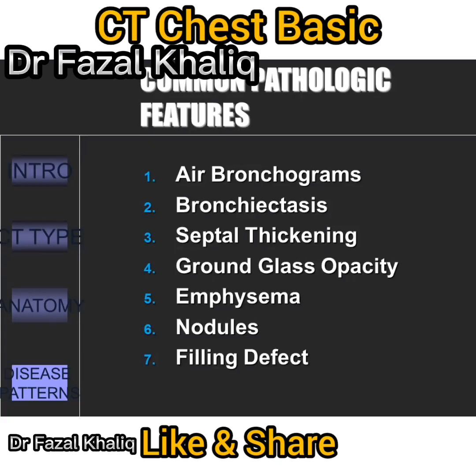Okay, so the first 2 sections covered the basics. Now, let's get a little more sophisticated and explore the common pathology that you are bound to see. Learn them here, then call them out when you're reading a scan with a radiologist, and you can be sure to impress.